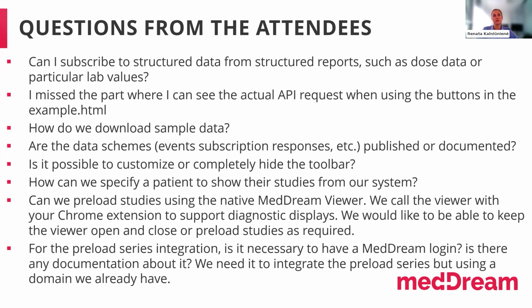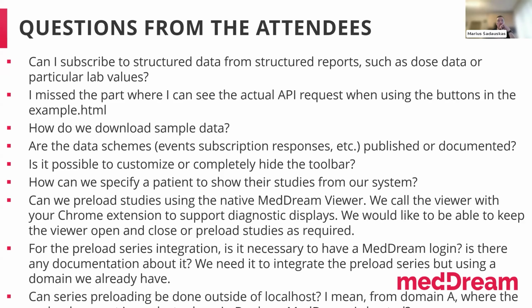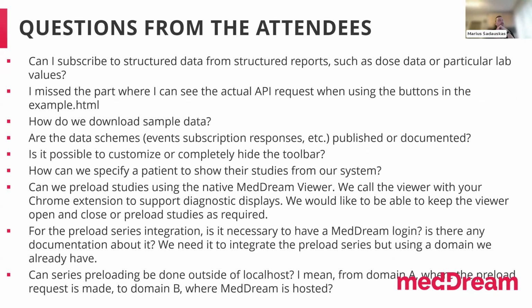Is it possible to customize or completely hide the toolbar? Yes, it's possible to customize. It's possible even through the user interface. You can disable the options which you don't need.